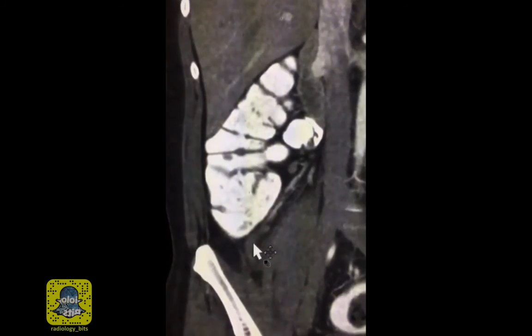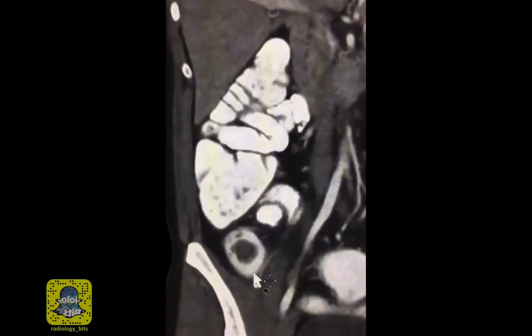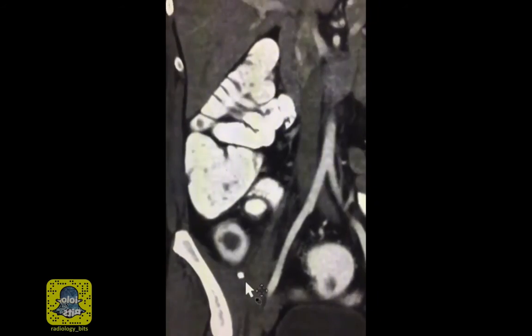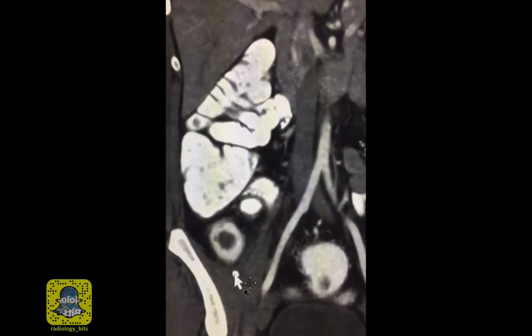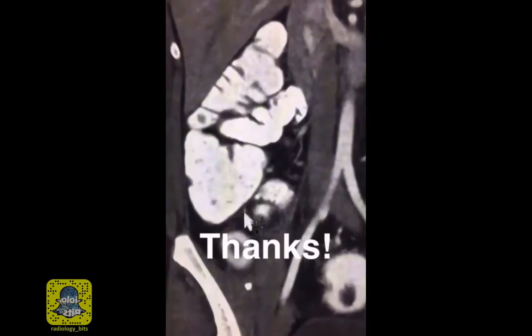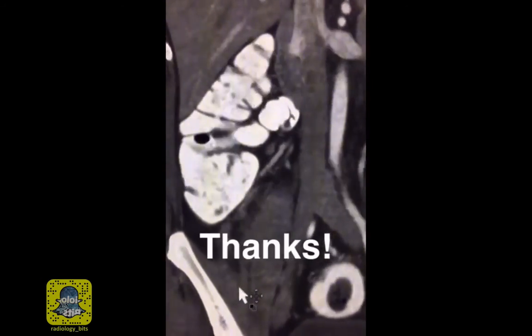And when you see an inflamed appendix, such as what we see here on the coronal image of this same patient, make sure you don't have a free appendicolith. Here's the appendicolith on the coronal image, and this could be close or even far away from the appendix. It changes your report from no perforation to at least a sealed perforation.